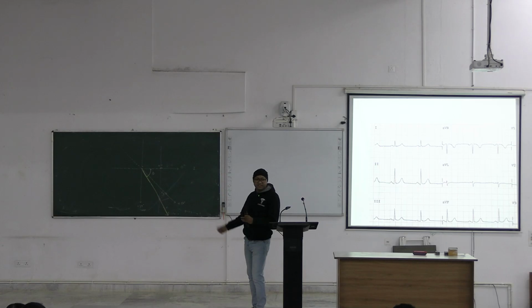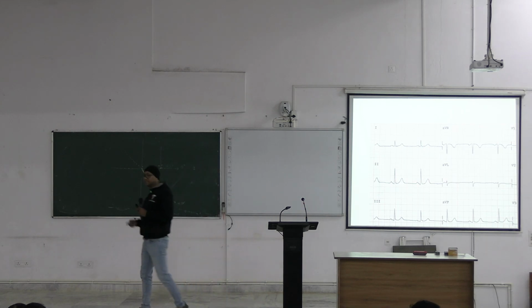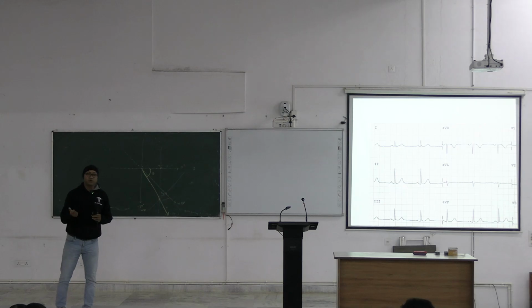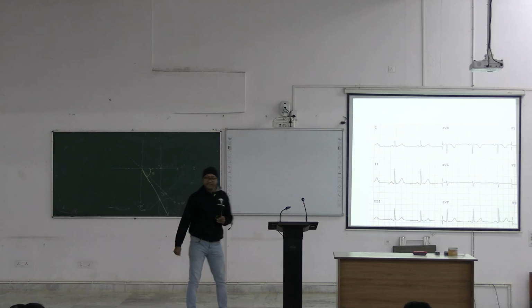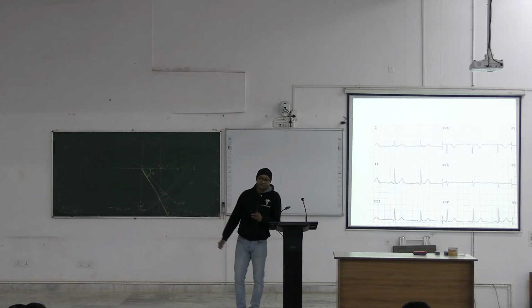So it may be 70 degree or 75 degree around. Okay. So this is how we calculate the exact angle of ECG axis, and the normal axis you already know, it is minus 30 to plus 110 degrees, and here in our example it is coming to 70 or 75 degree, and it is normal axis.